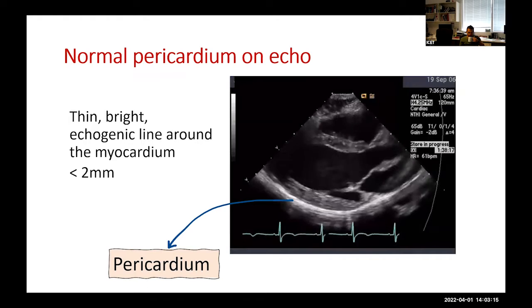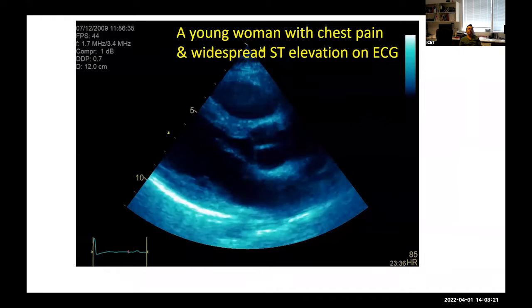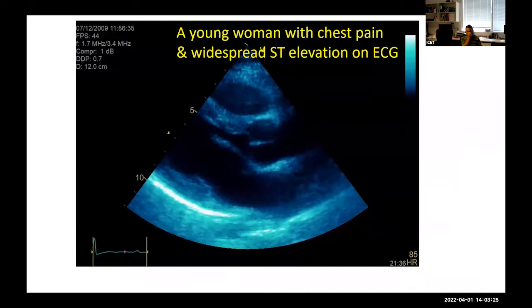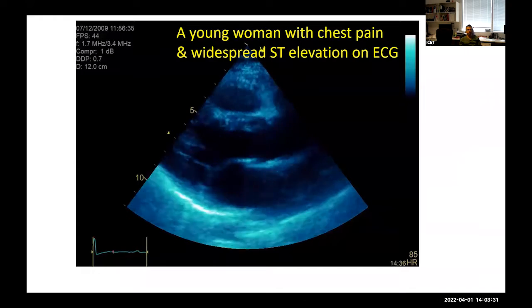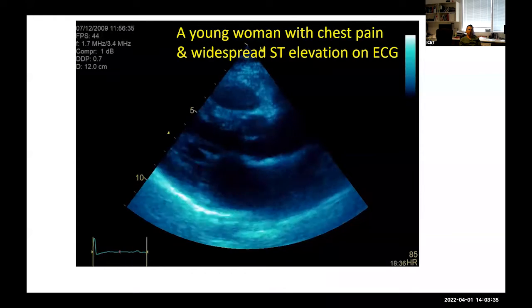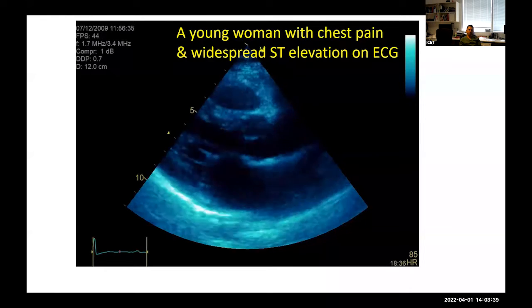So this is our first case. We have a young woman who presents to ED with sharp chest pain that's worse on movement, but eased by sitting up. And she has widespread elevation of ST on her ECG. Kalpana, what are your thoughts when you see this?